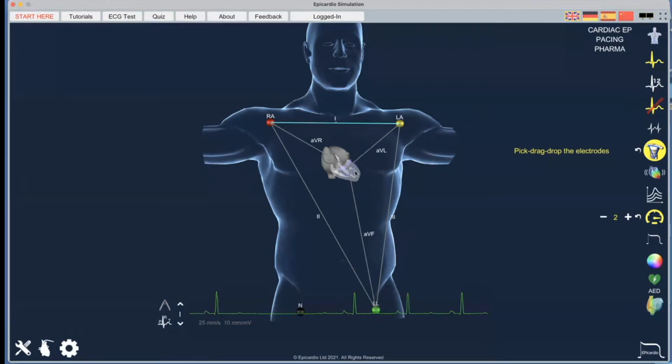You see? This yellow vector represents the electric heart vector. It's the average electrical activity flowing through the heart. It's the average action potential, which is given as a vector because it has a direction and it has a magnitude. Now that vector is projected along lead 1 to generate the ECG over time. You see that little yellow line going positive, negative on lead 1.